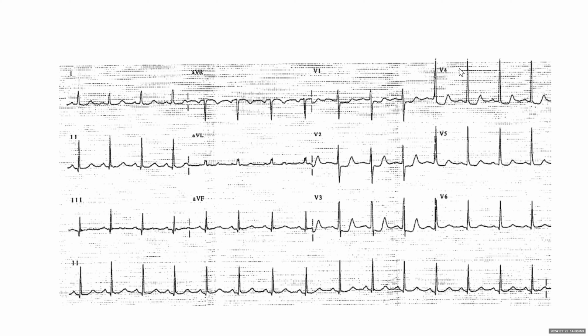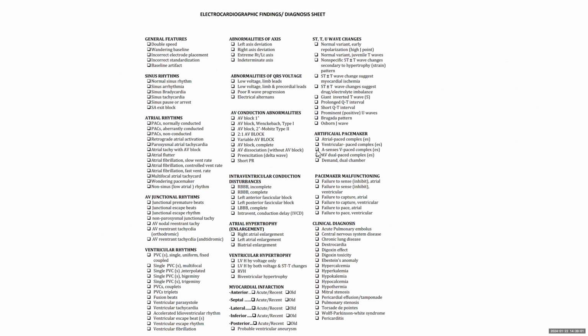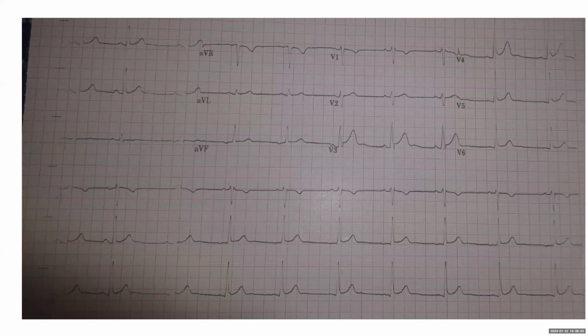Any questions about this ECG? No? Okay, we'll move to this one.